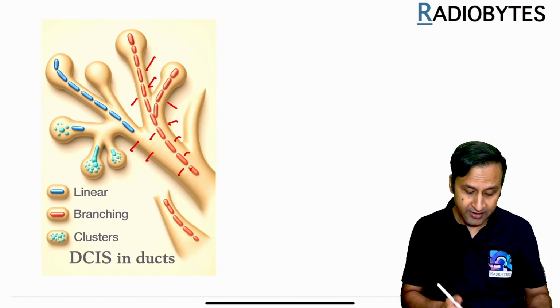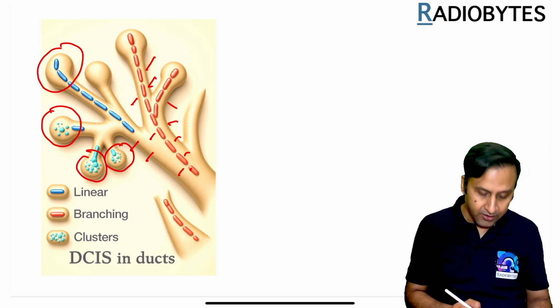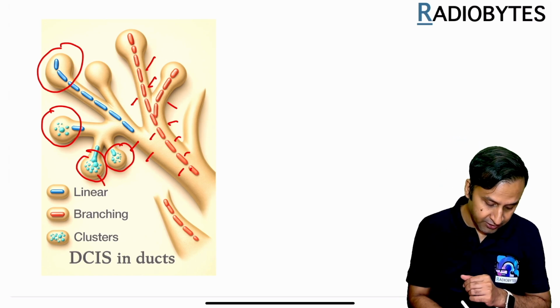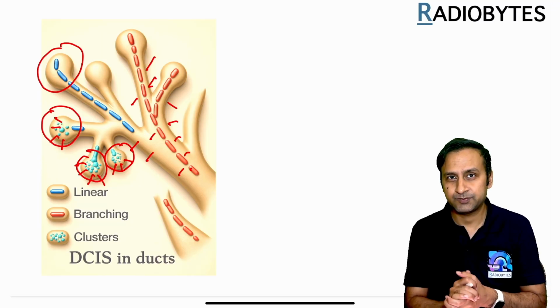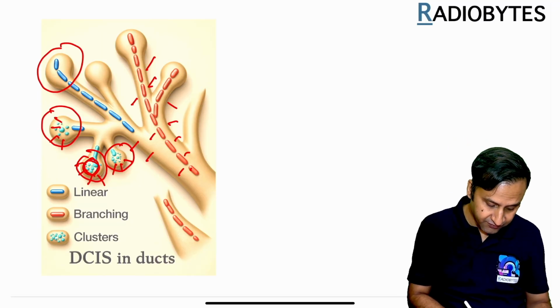On the other hand, when we talk about breast parenchyma, we also talk about these structures which are nothing but the acini. Now, if there is a disease which is more widespread, which results in inflammation of these acini, or any pathology which is affecting these acini, that is the terminal units, this will also result in formation of calcifications here. But the pattern of calcification will conform to the shape of these acini, just like this, just like this, just like this.